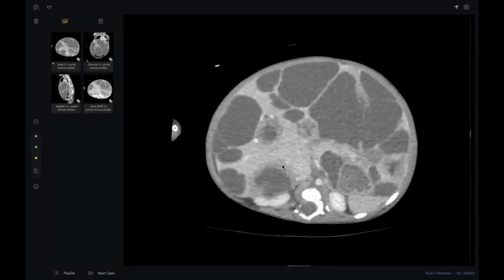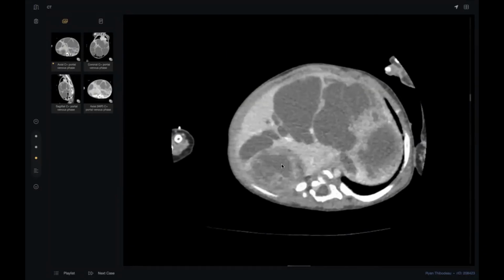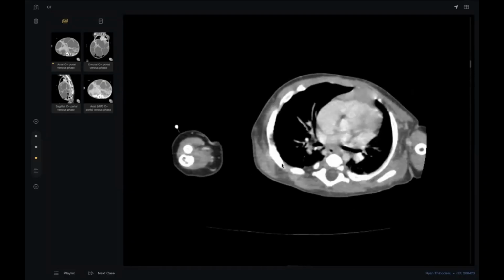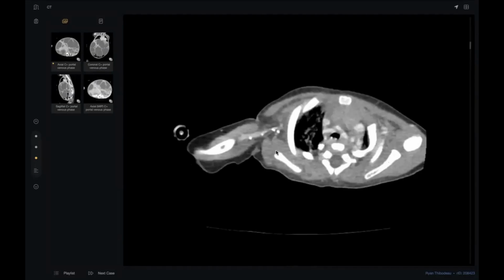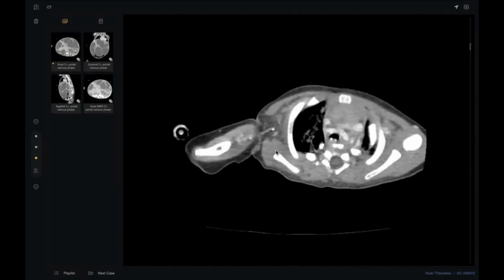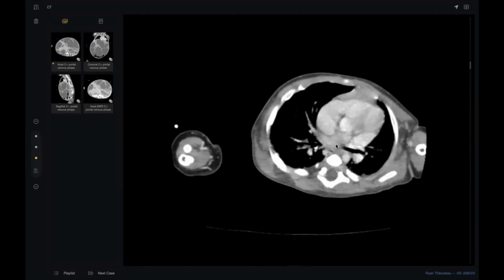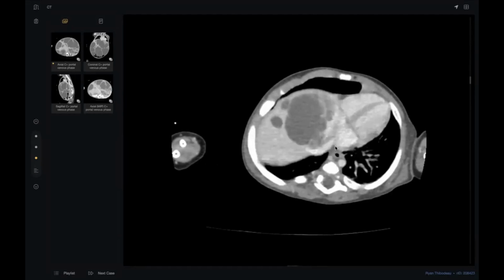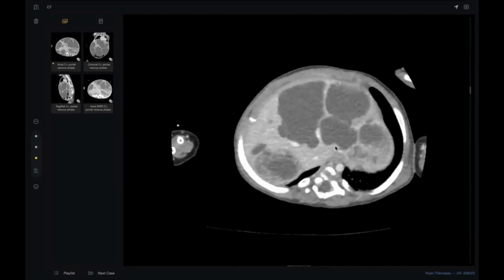So I will inform the findings to the patient, and also will suggest referral to the pediatric gastroenterology oncology MDT. In my routine practice, I would like to see the lung window to see any evidence of any intrapulmonary lesion. Note is also made of the thymus in this case. Also, I would like to see the bone window to see any changes in the bone if available. Thank you. In your opinion, doctor, what is the most probable diagnosis?